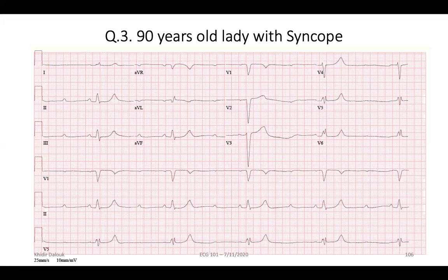These are ventricular escape rhythms. Ventricular escape rhythms are usually wide and very slow. Junctional escape rhythms are usually narrow and faster than 30. They're anywhere between 40 to 60 beats per minute. If it's slow and very wide, these are usually ventricular escape rhythms.